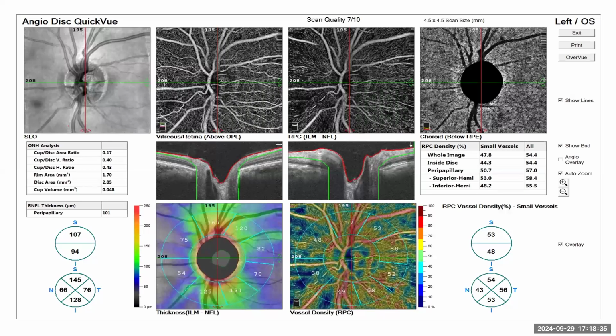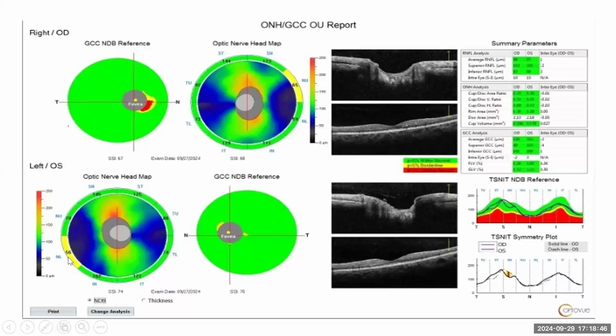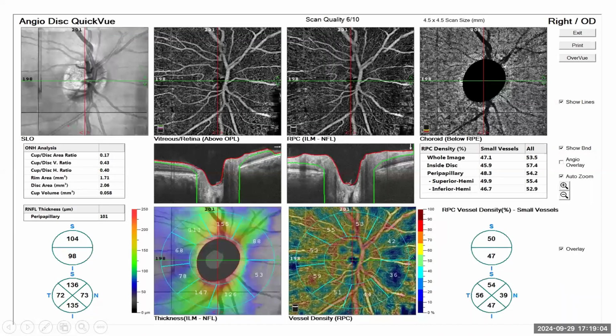If you judge with the OCT, I'm going to bring up the OCT. If you judge with the OCT of the patient, you would actually notice that there are some losses already, although they are minimal. And if you submerge the areas of minimal losses into the whole count, you will say everything is fine because the summary of the indices is all in green. But now, having a vessel density that looks this reduced means that you'd have to follow up the patient closely.